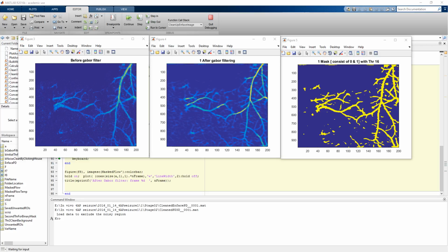So this is the image. We can see now it's more clear, and there are lots of small blood vessels. This way you can set the value of S and P until you are satisfied. It depends on you. There is no quantitative way. You have to do all of this in a qualitative way.